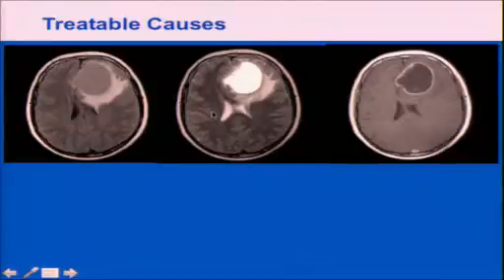That's another patient, a younger patient in the early 60s, also from the psychiatry outpatient clinic, who presented there with dementia. And that patient had a large frontal tumor. This was not a benign tumor, it was a malignant tumor, glioblastoma. But after surgical resection and debulking of that lesion, the dementia symptoms completely resolved.